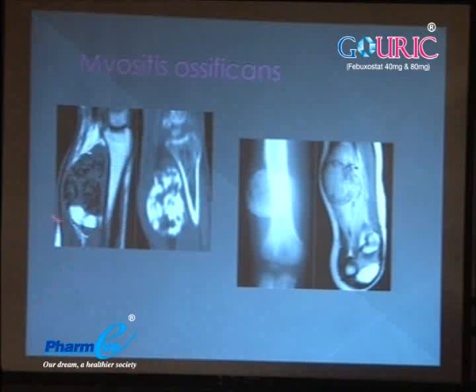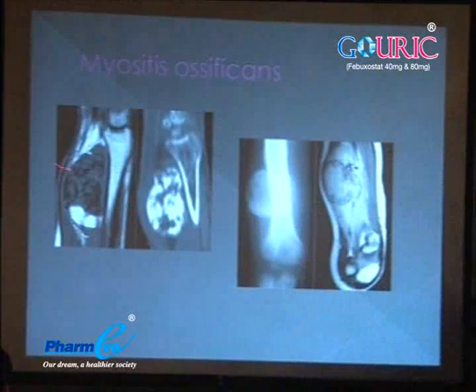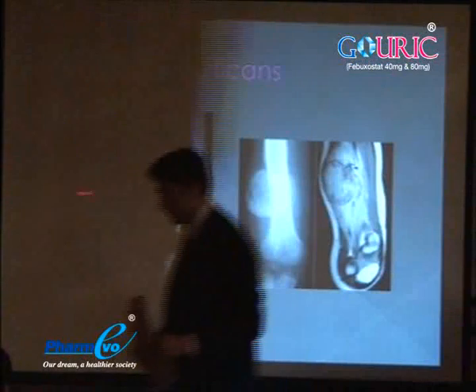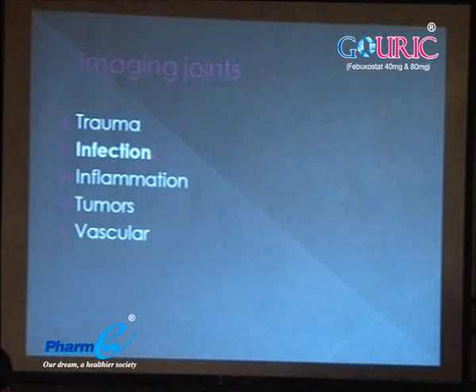And what happens later on? It ossifies, it calcifies. And what happens to calcium? As soon as you start getting calcium in this tumor, you start to lose the signal. Again, calcium has no available water molecules, and this is going to become dark. This is what it looks like on CT, but you lose signal on MR. That's an X-ray with the same thing.